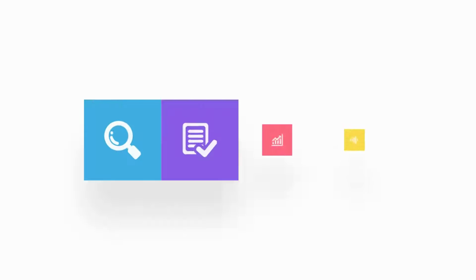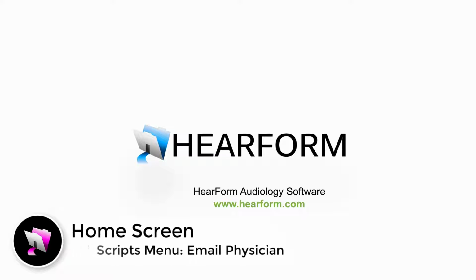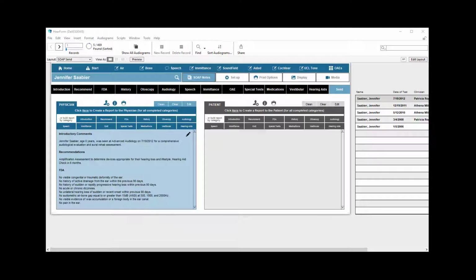This video explains the scripts option, which allows you to email the current screen to the selected physician. You may already know that there are a number of ways to send an email to a physician that has been assigned to a given patient.